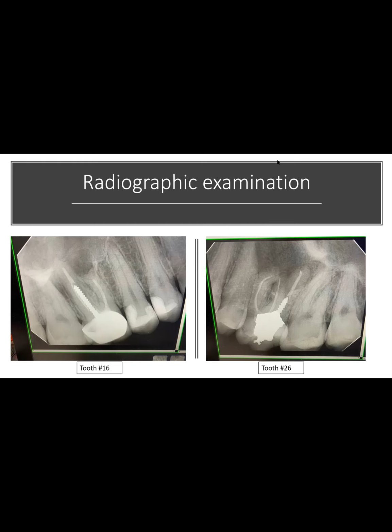She was seen by the dentist who prescribed those PAs. He looked at them and discussed with her that a root canal would probably cost exactly the same as doing an implant. Why don't I send you to Dr. Hassan? You can extract the teeth and have an implant.